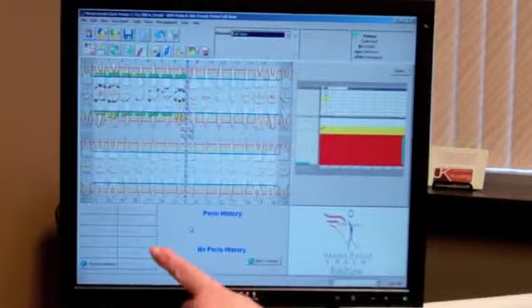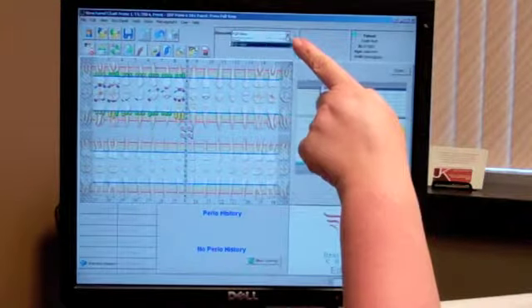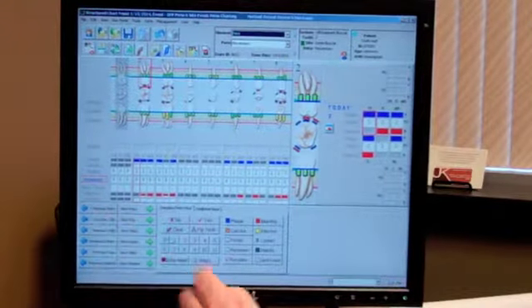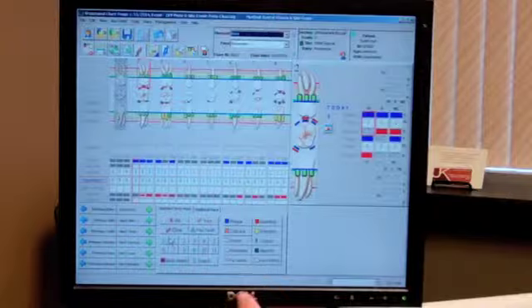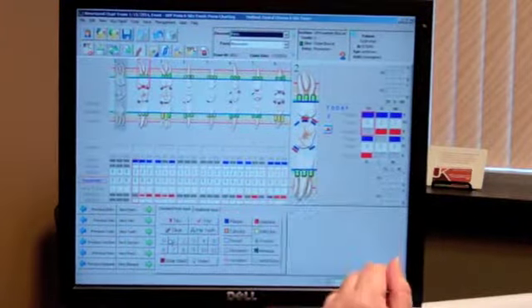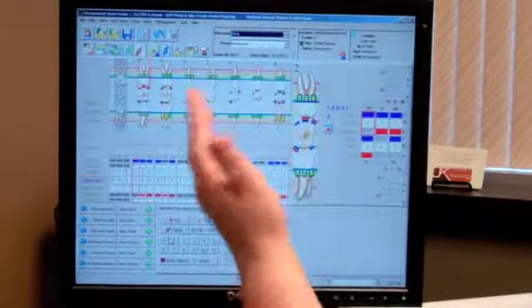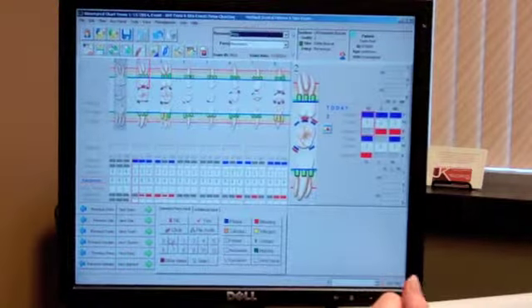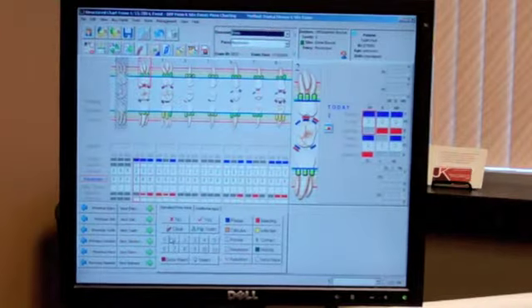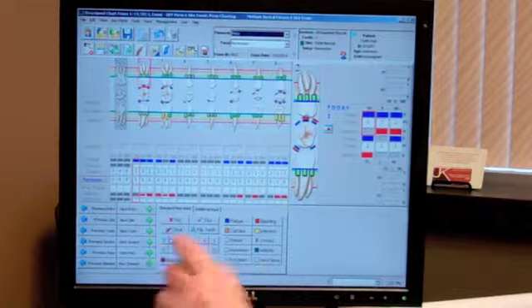I'd like to explain this section of the chart, but to get these highlighted, we need to go back up under Element, click on Perio, then these will be more bold here. These you can do manually or with your voice activation as you're charting. If you make a mistake or want to look back, or go to a different tooth, say I want to get to tooth number 4, I would on the voice activation say next tooth, or you could click on it.